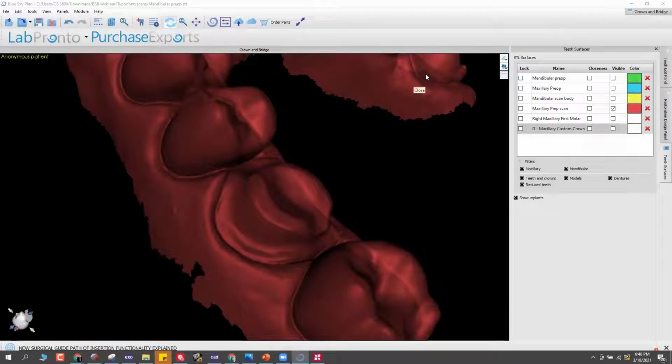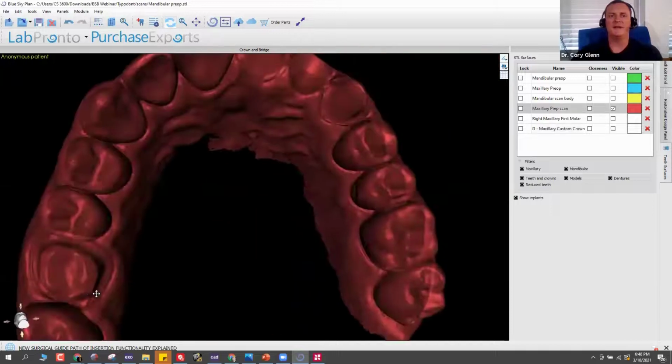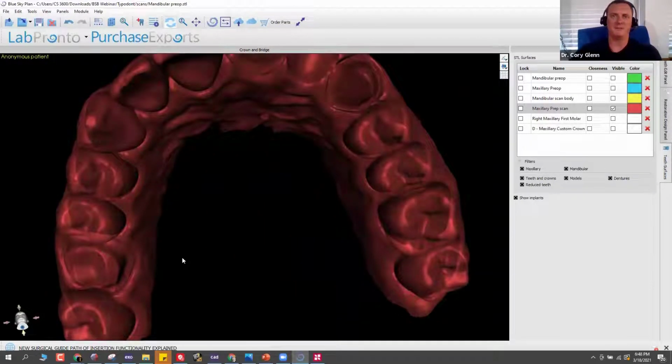There's another question about the thickness of the crowns. When adding thickness to the crown, what prevents having a high spot in occlusion? And connected to that, somebody else asked, how do you control the final restoration thickness? Yeah, so you've got a minimal thickness parameter in the design, which I'll show on this next one. So anywhere that it's not thick enough, you're going to see a big red spot shining through, and you can force the software to maintain that minimum thickness.